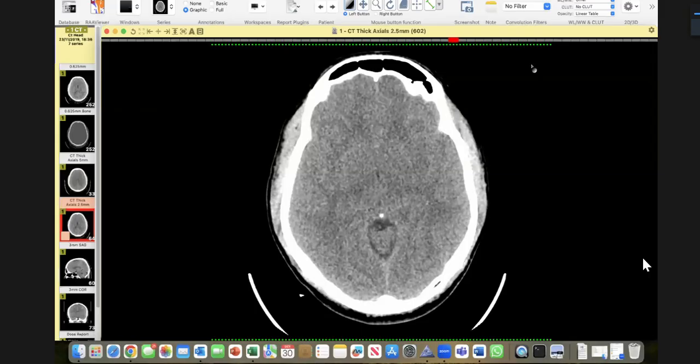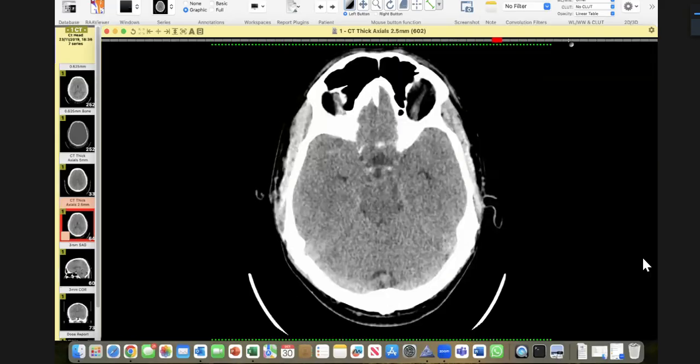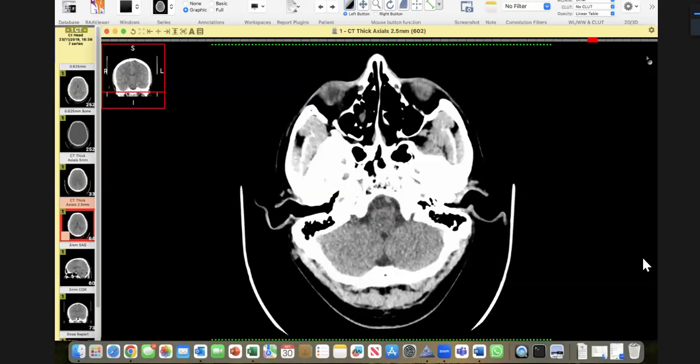Sir, you are scrolling for me. Have you got the code? Try it. Okay, sir. Sir, I will once again go through the entire stack.